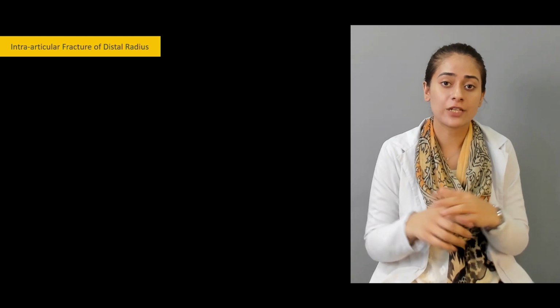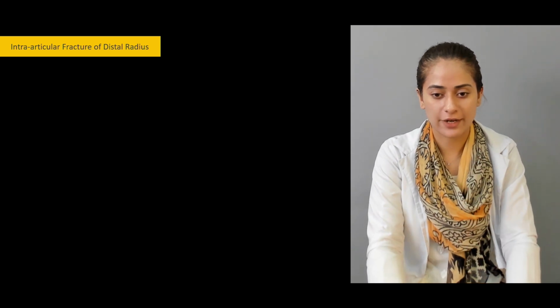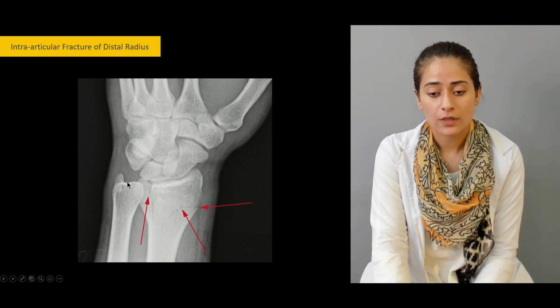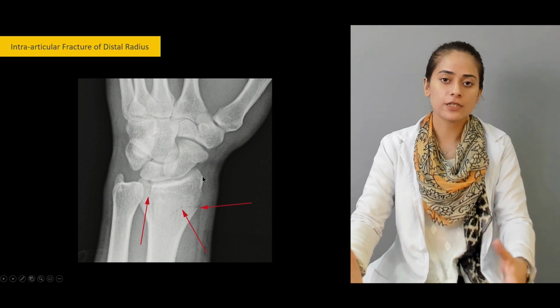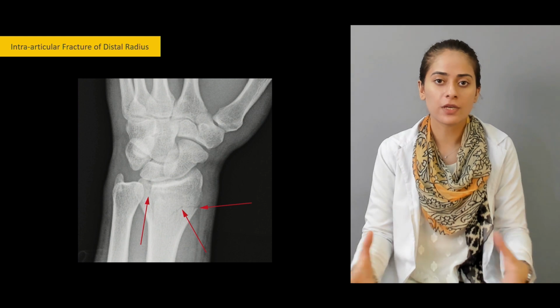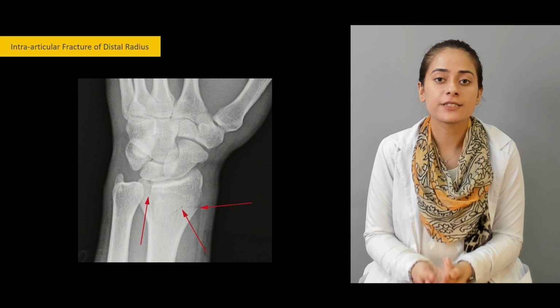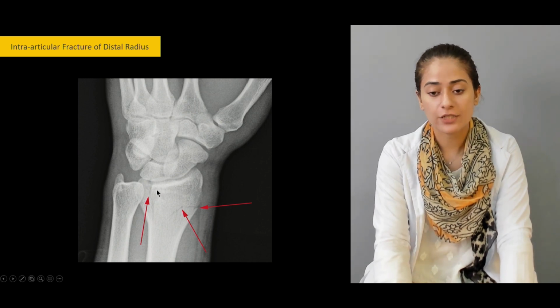The distal radius head is fractured, and I will explain what the intra-articular fracture is and how that's different, but it's better that I explain on a radiograph. So this is the intra-articular surface, right? So what actually is the intra-articular surface? Intra-articular surface is the surface which is forming the joint or is present inside the joint capsule, right?